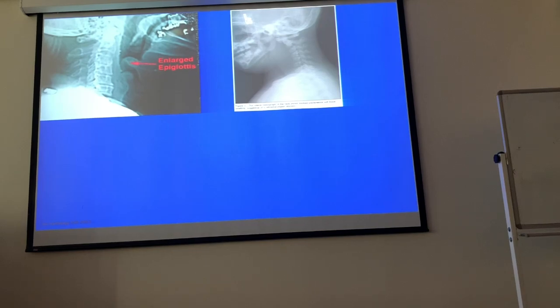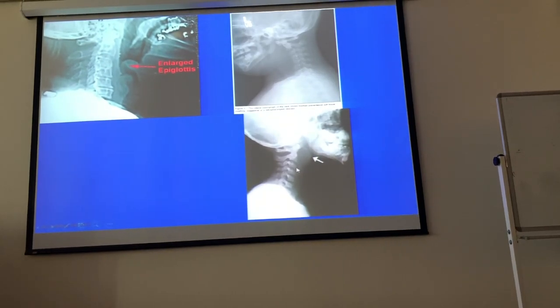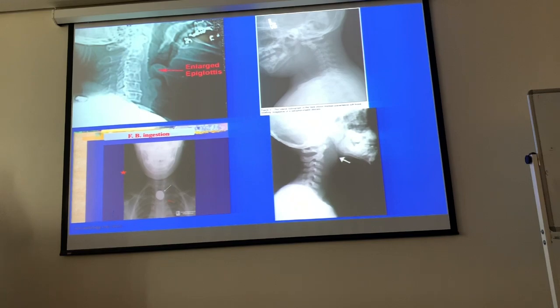Retropharyngeal abscess. Another mass lesion. It can be retropharyngeal abscess as well, but it can be any soft tissue tumor. But this is pediatric. In pediatrics, we usually see abscess or infectious process. But in elderly or in adults, you cannot exclude tumors. So you do CT scan or MRI, but usually CT scan, and you see things.